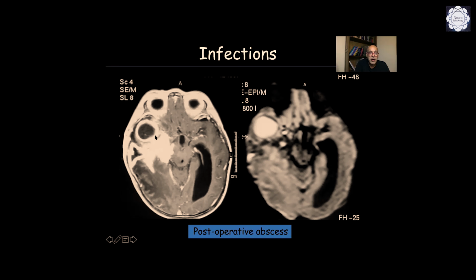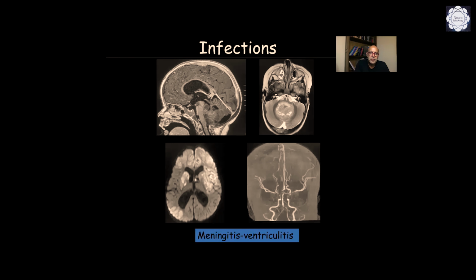But there are other areas here. You can see enhancement at this level without restriction. This is probably scar and or tumor. So we have to be very careful with this diagnosis.